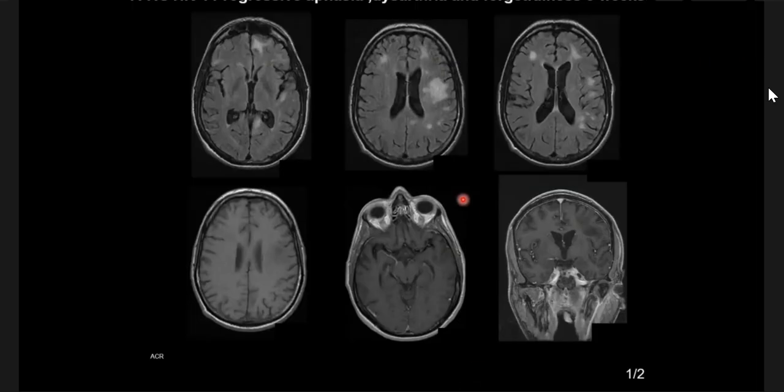Over to you. Sure. So there are multifocal patchy confluent signal alterations, mainly involving the white matter, most marked in the left cerebral hemisphere. I'm just trying to check whether the subcortical white matter is involved in this case. I can see that some areas are involving the subcortical white matter as well. And given the patient's history, I'm thinking of deciding between PML or HIV encephalopathy, because it's an asymmetric appearance and involves the subcortical white matter, so this will favor PML.